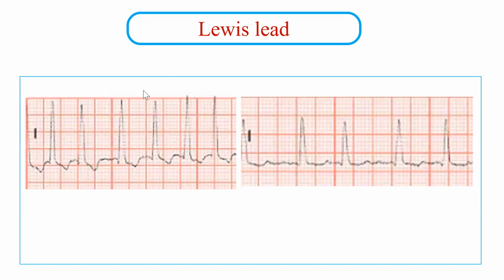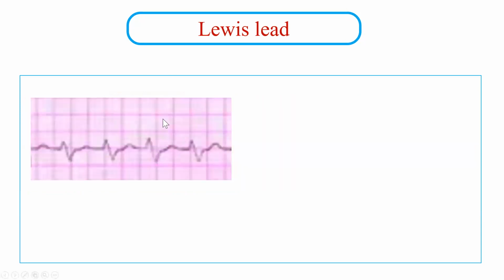One more example. If we look at this tachycardia here, this is a wide complex tachycardia. The heart rate is almost 150 or a little bit less than that. There are too many syndromes that can cause this, so we don't know what is going on with this patient. We cannot see a P wave before the QRS, so we don't know where the focus is originating. Is it originating from the ventricle or from the atria?